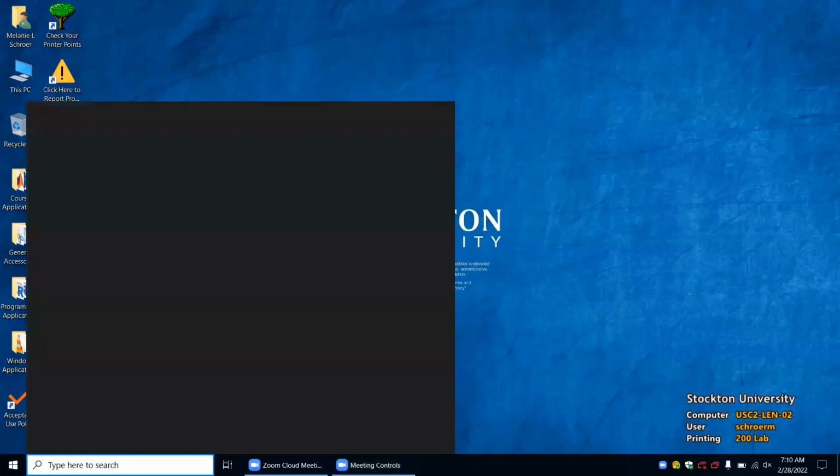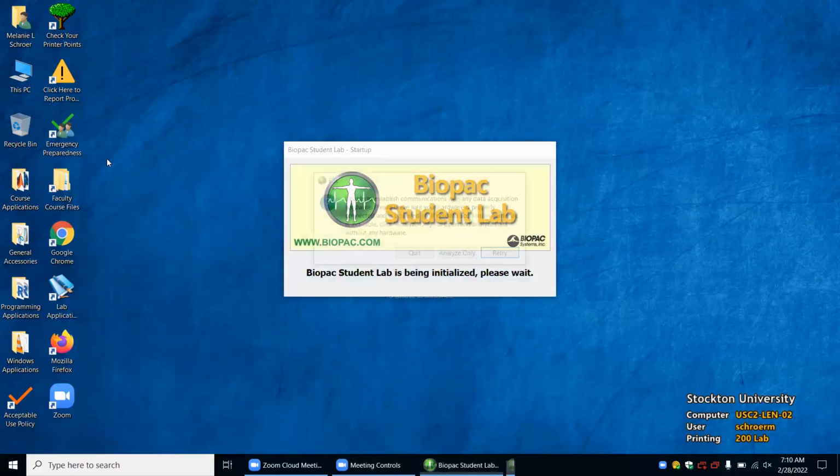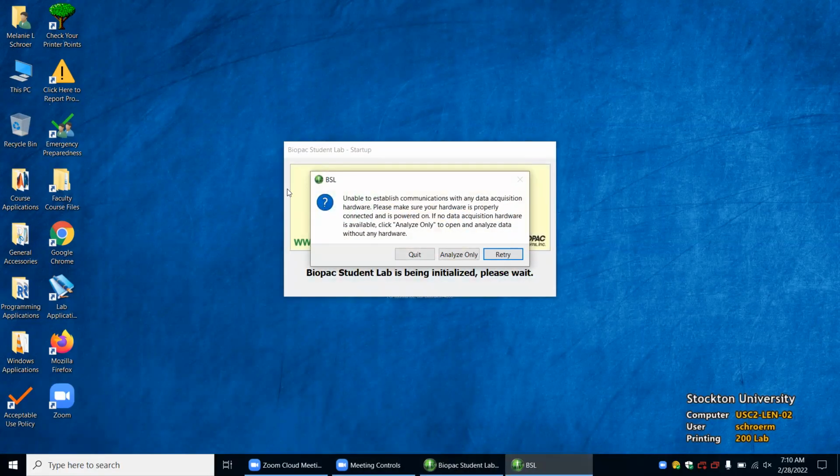In this video, I'm going to show you how to work with the BIOPAC software on a school computer. Now, I am not hooked up to the BIOPAC machine, and so I am just going to analyze only. So you'll see this if you're not hooked up to the machine. If you are hooked up to the machine, then the computer isn't seeing the hardware, and so make sure that the unit is on and then click retry.